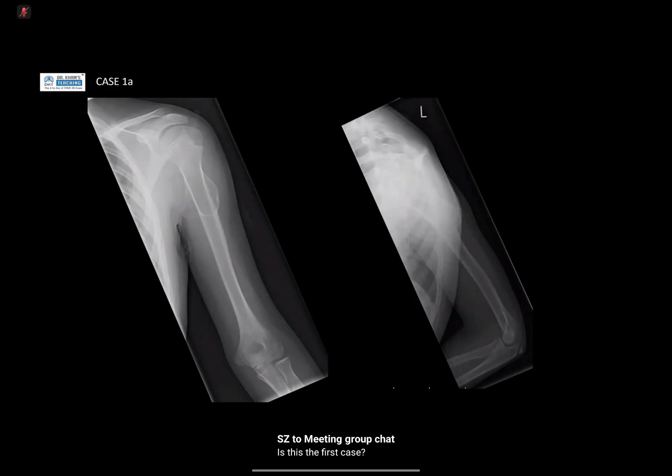If the patient has pain, I'm suggesting there is a malignant change of osteochondroma. I will review if this patient has MRI before to see the cartilage cap thickness. If this is more than 1.5 centimeters, I will go with chondrosarcoma transformation of osteochondroma. I would also want to rule out soft tissue change for this advanced transformation of the patient from benign osteochondroma to chondrosarcoma.